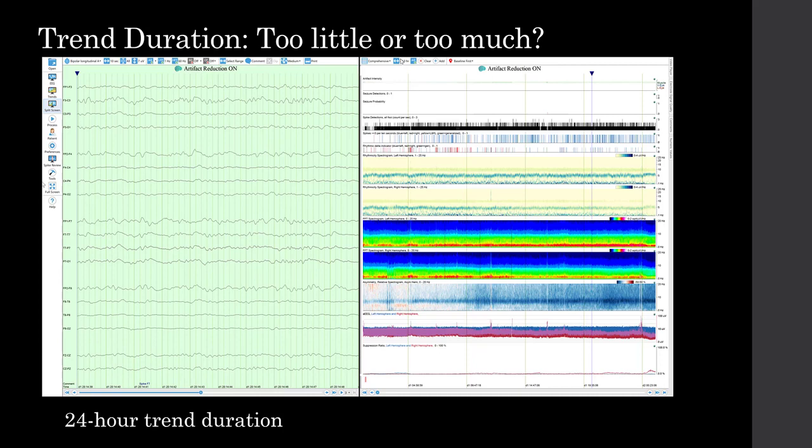But it's important not to get stuck in one time duration or another. It's just like zooming into the street view or zooming out to a satellite view. There's not a right view. It's the idea of picking the trend duration that lets you see what you're hunting for. So let's go ahead and from there move on to looking at individual trends.